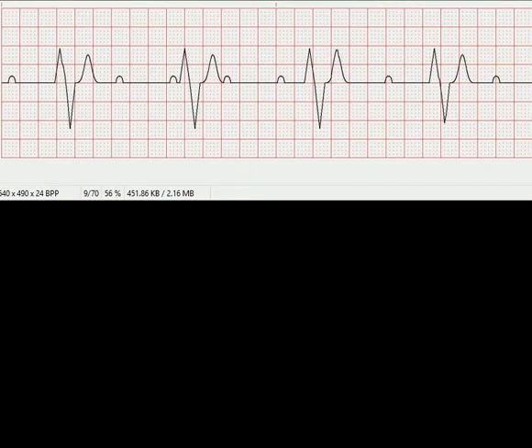All right, last but not least, go ahead and analyze through this using our steps and pause the video, and then we'll work it together.